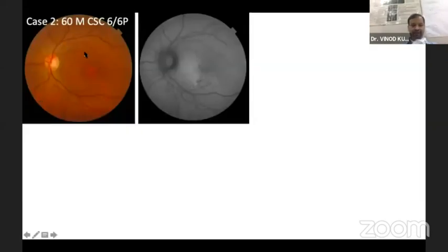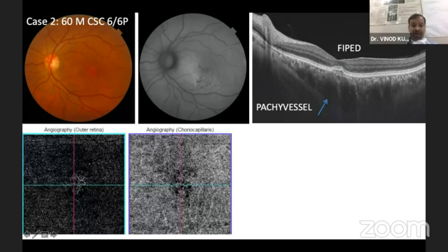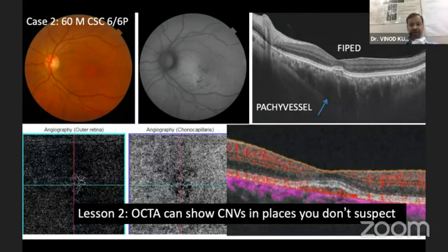Now this, on the other hand, is an elderly patient with good visual acuity, again a patient with CSC, as can be seen on autofluorescence imaging. You can see some pigmentary changes over here. OCT very clearly shows pachyvessels in the outer choroid and attenuation of the inner choroid, and in the retina we see a flat irregular pigment epithelial detachment. Now, very interestingly, OCTA does show us a very clear-cut defined membrane in this condition, which is visible on the B scans.